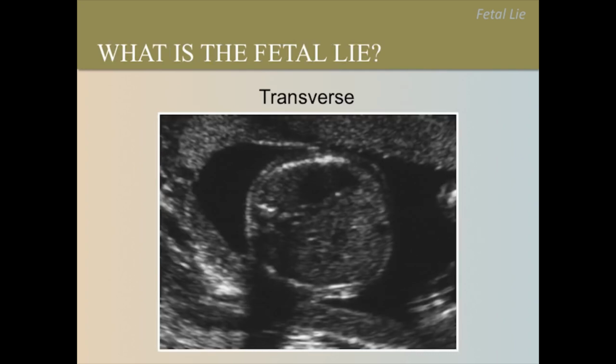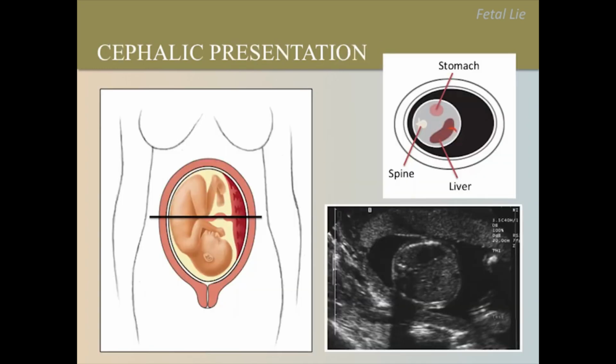What is the fetal lie and presentation in this case? Note that this image is in the transverse plane. Please pause the video now to encourage responses from the group. Here we can see the fetal stomach and fetal spine. This illustration shows that the fetus has a longitudinal lie and cephalic presentation with the fetal spine on the maternal right. Please ask your trainer to demonstrate this fetal lie with a doll prop. Then compare the structures in the drawings with the structures on ultrasound.